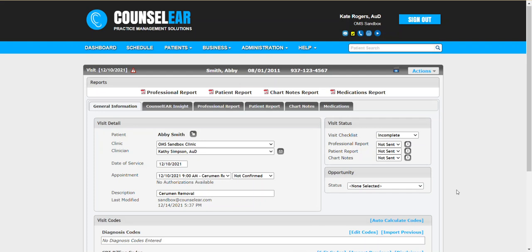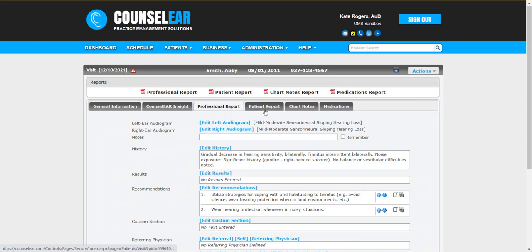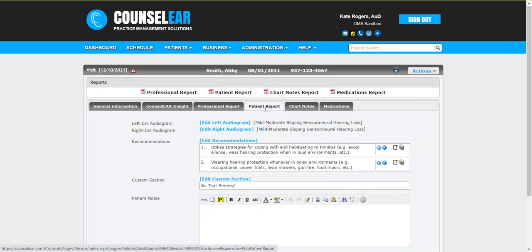Welcome to the counselor overview for creating patient reports. We'll begin here in the patient visit screen. Now in this patient visit, we've already taken the case history, we've completed our testing, and now we're moving on to the counseling portion of the visit.